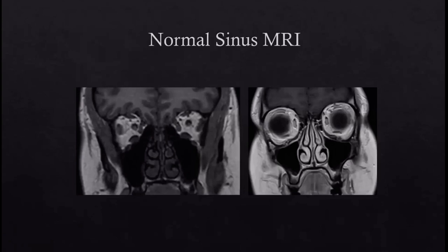You can also, of course, see sinuses on MRI. And here you can see pre-contrast and post-contrast T1 imaging, and just how avidly the mucosa lining the turbinate enhances. And you can see very nicely the maxillary ostia, the osteomeatal complex coming into here, the ethmoid infundibulum. Of course, the bones are easier to see on CT, but if you have any concern regarding tumours in the nasal cavity, then MRI is a very useful adjunct.